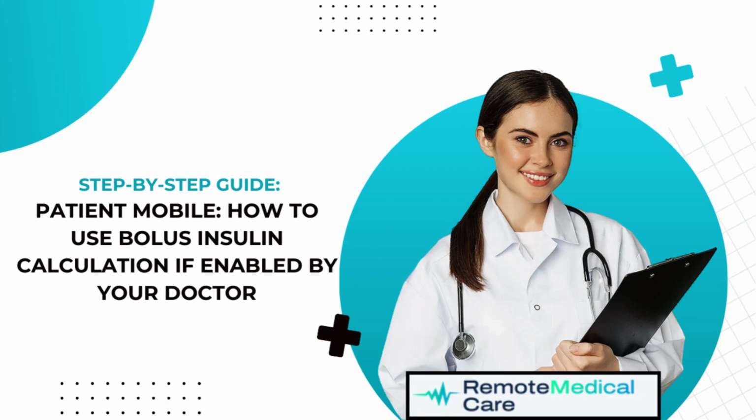In this video, we'll walk you through the process of how to use bolus insulin calculation in the mobile app when it is enabled by your doctor.